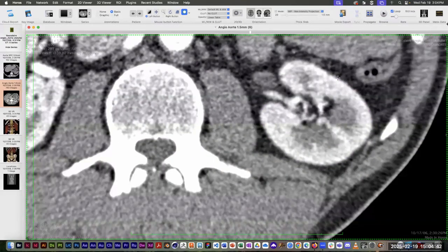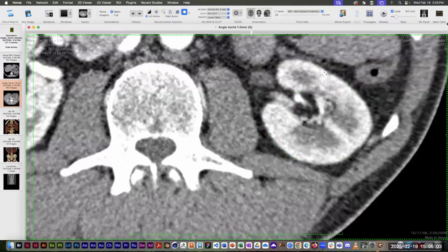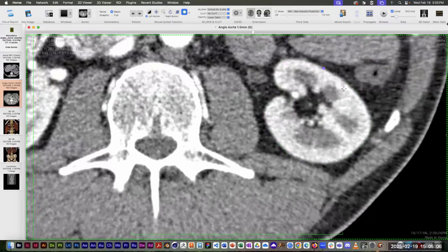with a very prominent indent on one side. Being a little sloppy inside the pelvis because we won't really see much in there. We'll just see that there's a deep indent. It doesn't have to be that precise.